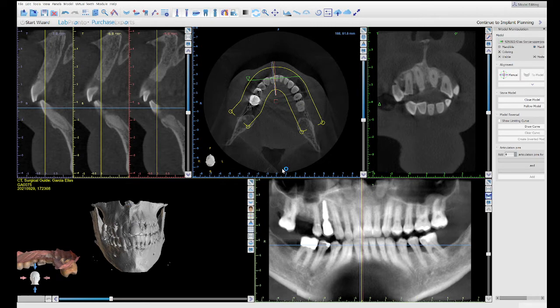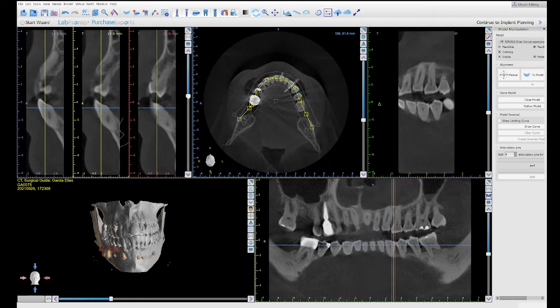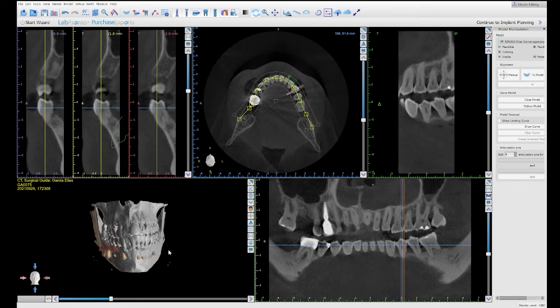If not, I'm going to show you, make sure to confirm proper alignment. I'm going to click OK, and you see it did not line up properly. One thing that I want to see is if my staff took the CT with the teeth open, which they did. So first, you can maximize each of these windows by going to the upper right corner. Each window has those buttons.